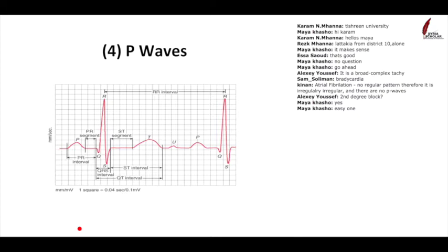The next stage is just to literally take each ECG component one by one and look through individually. So we'll start with doing that. The first bit we're going to look at is this. This is the P wave, which, as we said before, is showing you the atrial depolarization, which roughly corresponds to the atrial contraction.